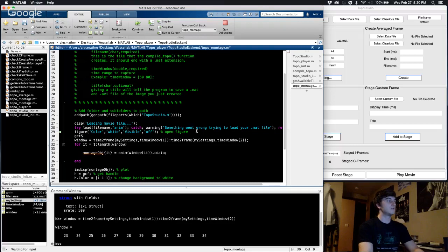So we'll do get available time points with our settings, S rate, and... yeah, see, actually, yeah. Wow.